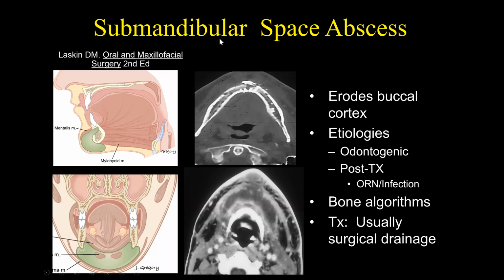Now, you can have other causes of infections involving the oral cavity and the oropharynx, and a lot of it is just based on the normal spread patterns of infections involving these areas. So we talked about Lemierre syndrome involving the tonsil and the parapharyngeal space. Now we can talk about infections involving the oral cavity.